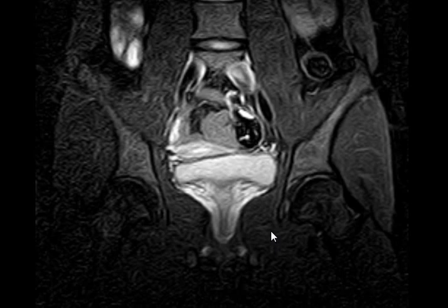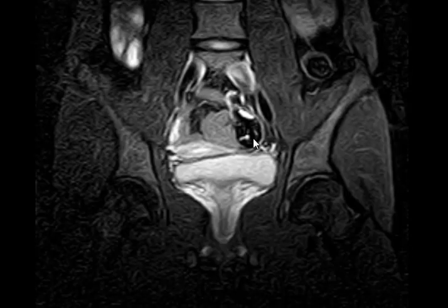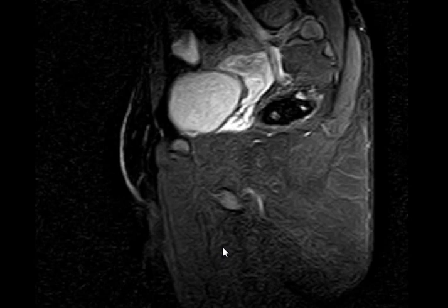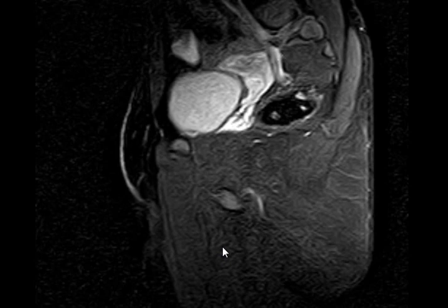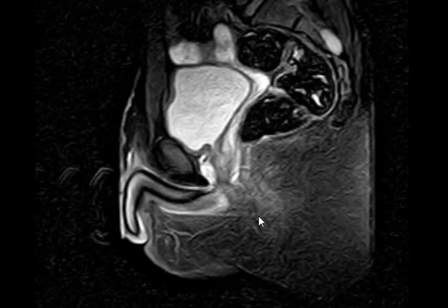abnormality. It's very big, very obvious, right in front of your face. And that's the very funny thing about this case. Let me help you, please. Let's see, what's this? Now, this sequence has all what you need to know. This is normal. Sure. This is rectum, bowel, yes, okay. And there, this is bladder.